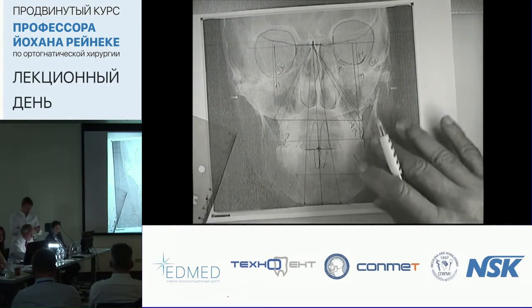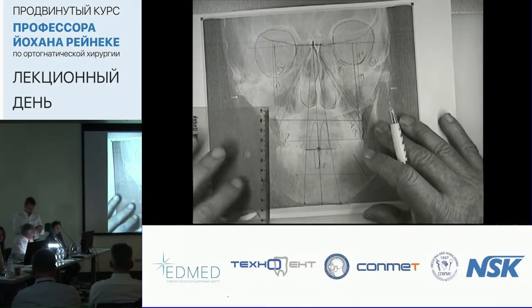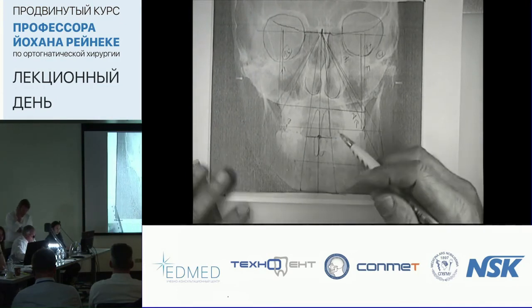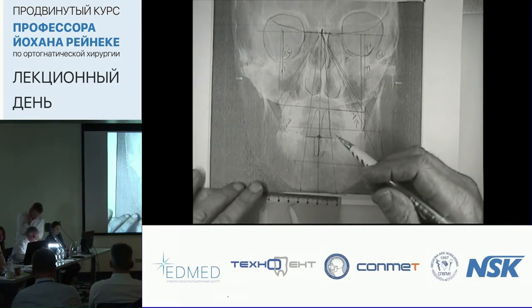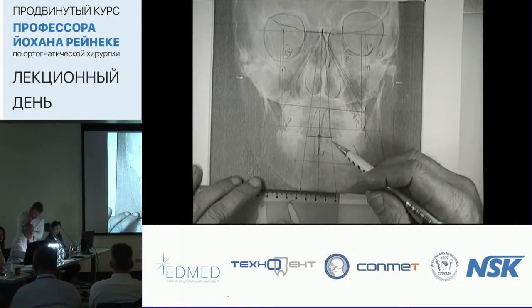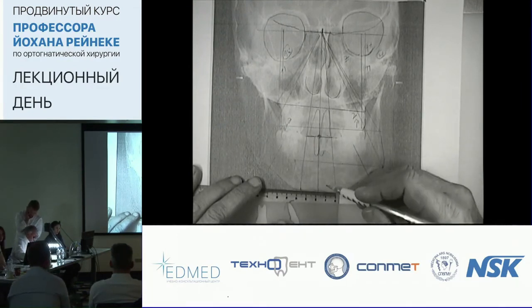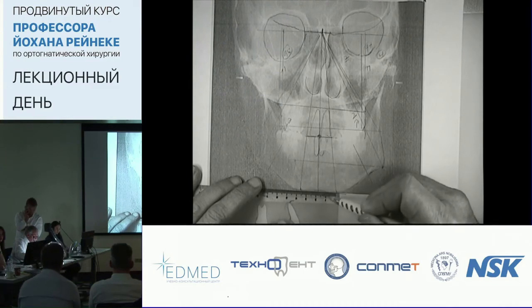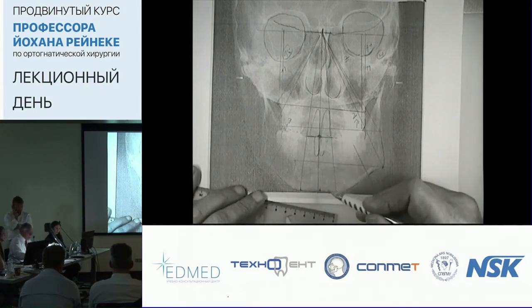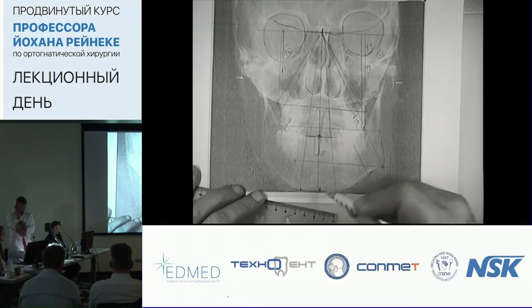And an important thing for me here, at the bottom here, I can measure the difference, this is 36, it's 15, it's 16, there, that's the middle.